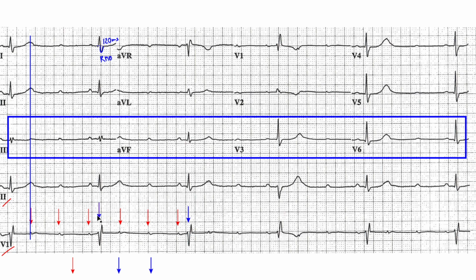So what do you have to do here? You have to take a look at the PR interval. If you can, let the machine run and see if this alignment doesn't change. If this alignment doesn't change for several seconds, and when I say several seconds, I mean more like 30 seconds or a minute, then indeed you have a 3-to-1 conduction block. However, if you see your QRS moving towards your P wave, or your P wave moving towards your QRS, then you have something else going on.